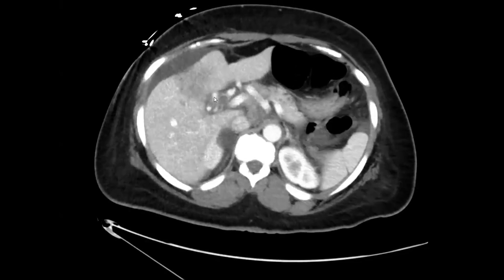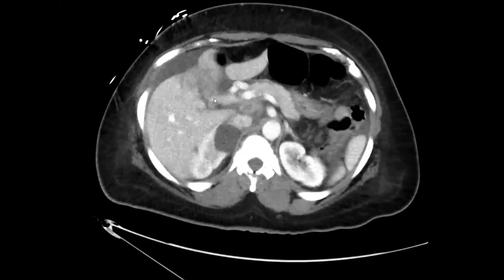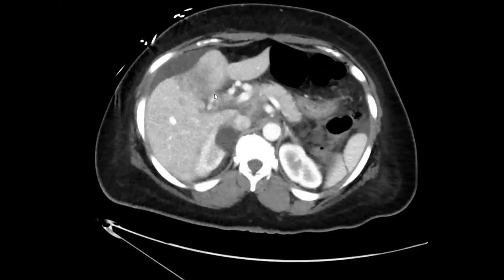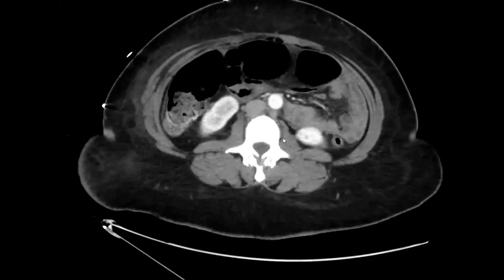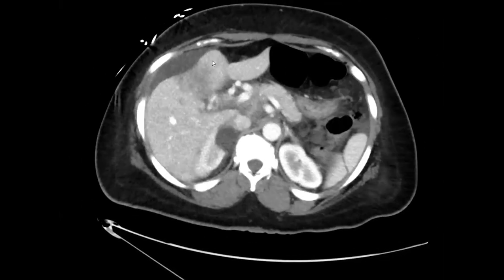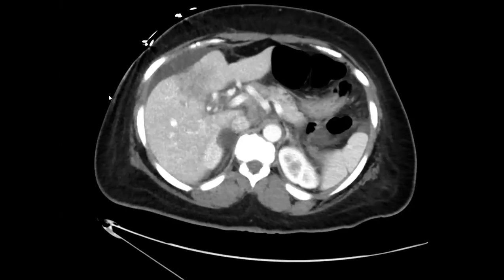Yeah, and it's irregular looking. Yeah. So the history was kind of a red herring. Everyone's like, oh, it's just postoperative changes from an aborted, bad gallbladder thing. But putting it together, with these drop mets, we basically have Krukenberg, huge mets to the ovaries. We have this infiltrative mass in the liver, indistinguishable from this irregular gallbladder. So they ended up biopsying this, and this was adenocarcinoma of pancreatic biliary origin.